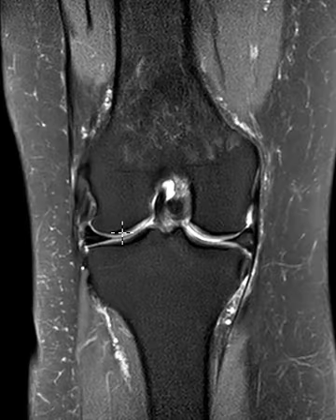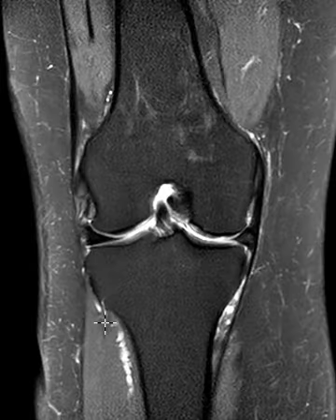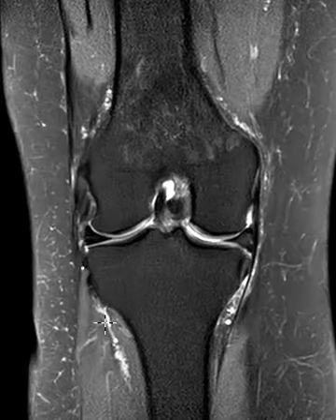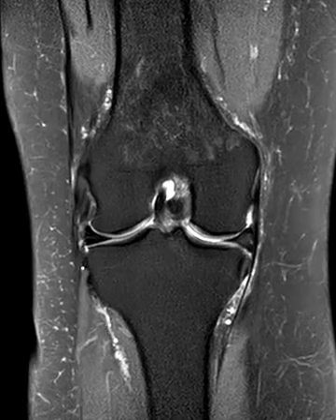And here we go. So this is a coronal PD fat sat sequence, and the question is, what would you think is a diagnosis based on these two? A little bit of time to think about it. Okay, so here it is.